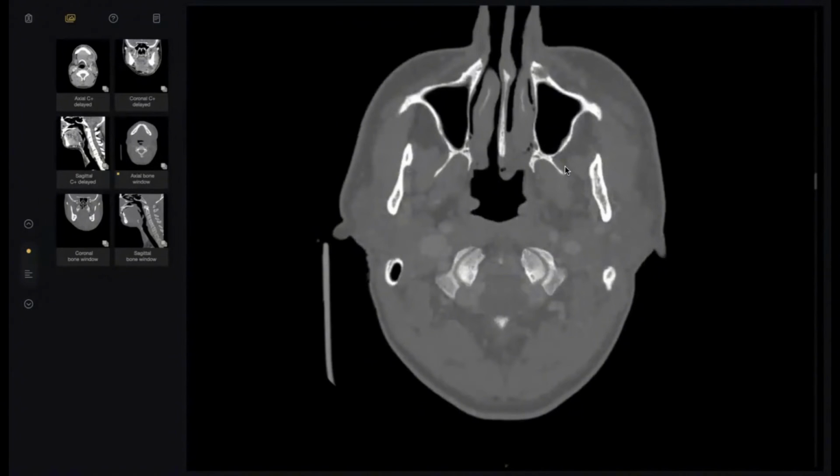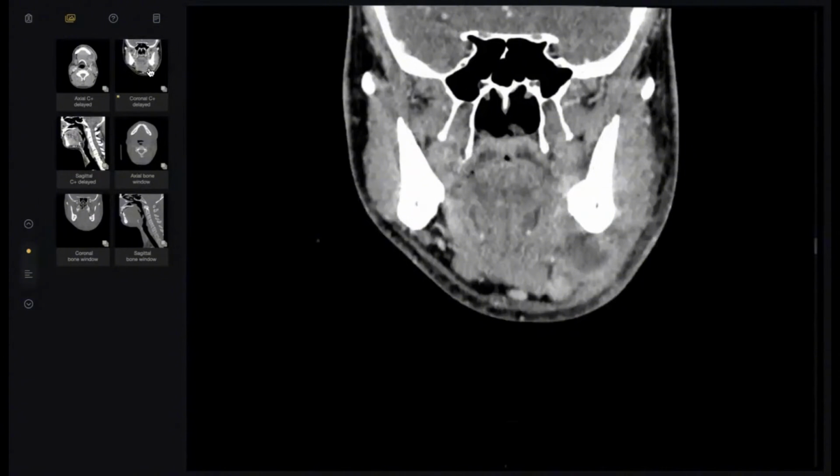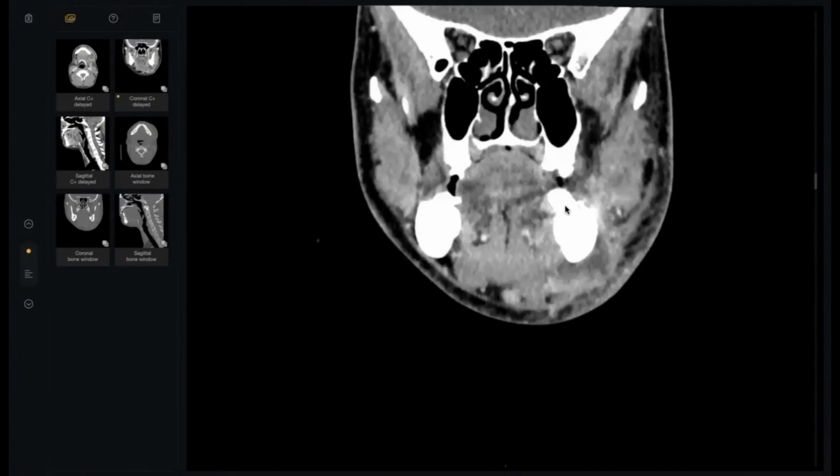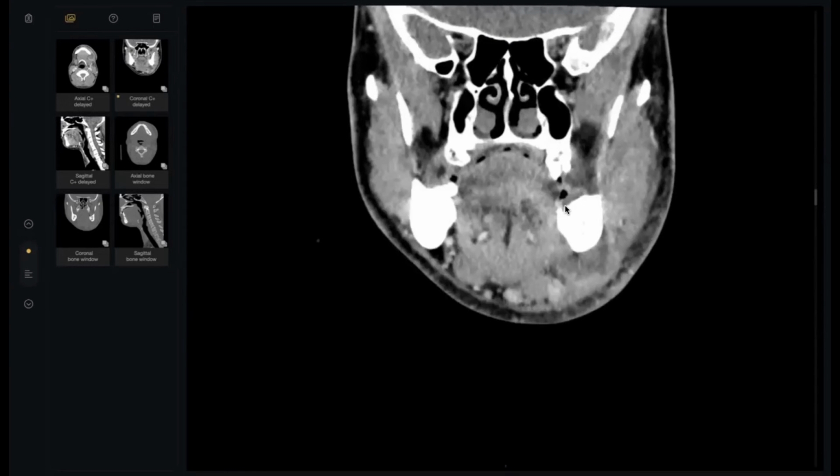So what's your differential diagnosis? I will just have a coronal view to look for the final. It appeared to be an abscess. Very easy. It appeared to be an abscess in the left aspect of the mandible, maybe related to this tooth caries. I will convey my finding to the referring physician, the ENT, for this tooth extraction and abscess drainage.